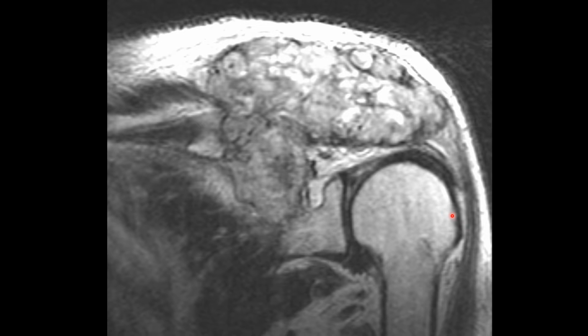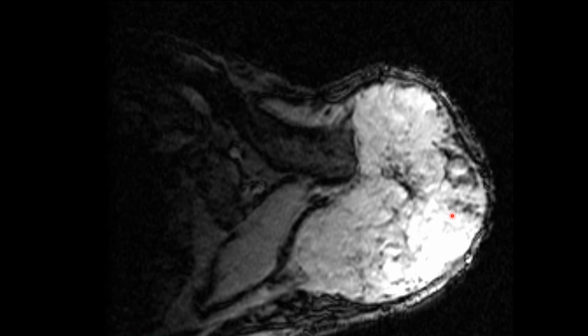And this MRI was performed 3 days after the x-rays were taken, and this is a coronal T1. You'll notice a very large expansile osseous lesion arising from the scapula and extending into the adjacent soft tissues. And this axial T2 slice demonstrates the large heterogeneous mass, and again, much larger than I would have thought given the x-ray appearance.